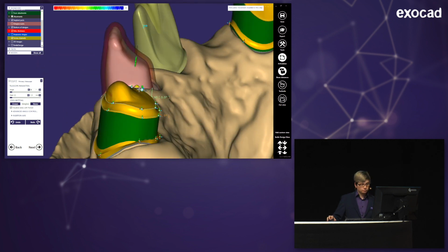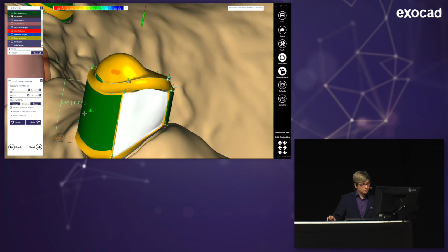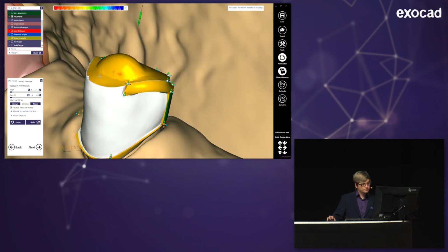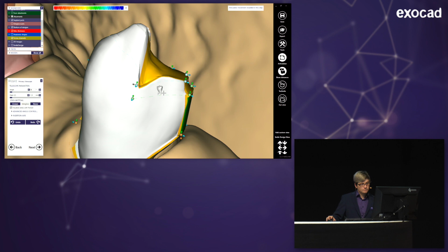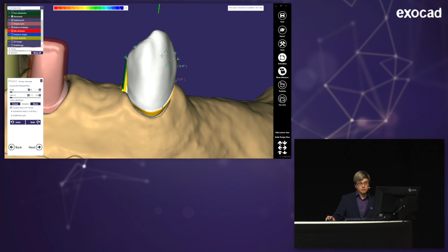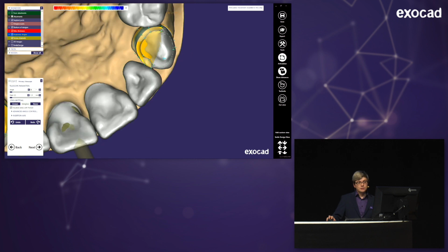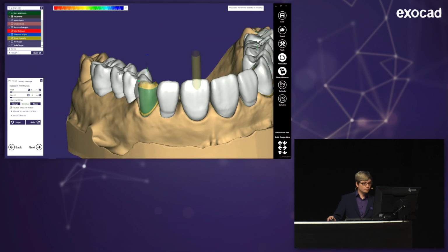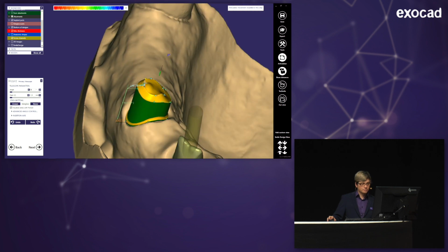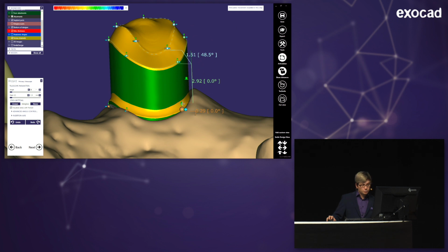And now that this is so far finished, I activate those points to switch them to anatomical shapes. Now you see I have a crown with a milled lingual here with an anatomical shape in the front. And I can and will actually shrink this later. But you can also just leave it as an anatomical shape, obviously. So I'm designing the same one over here, pulling up the lower border to secure the gingiva a little bit.